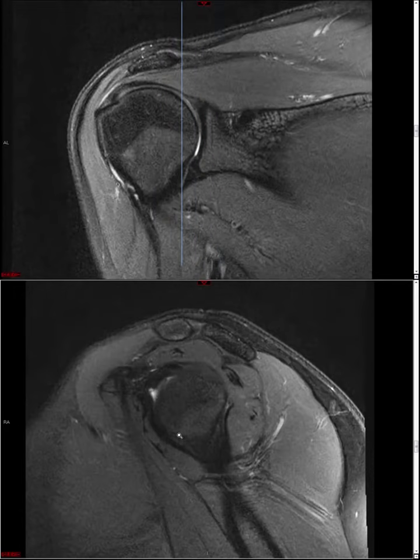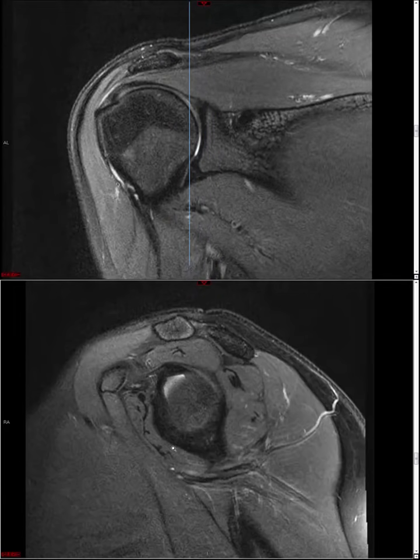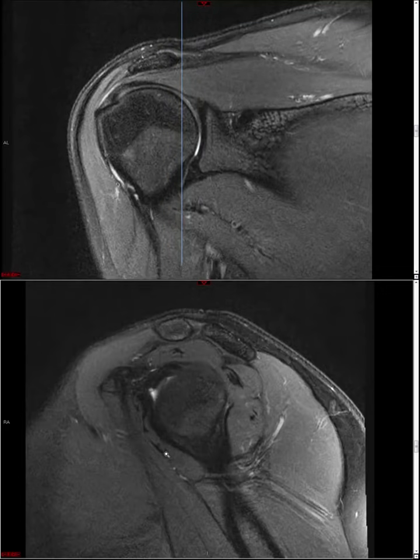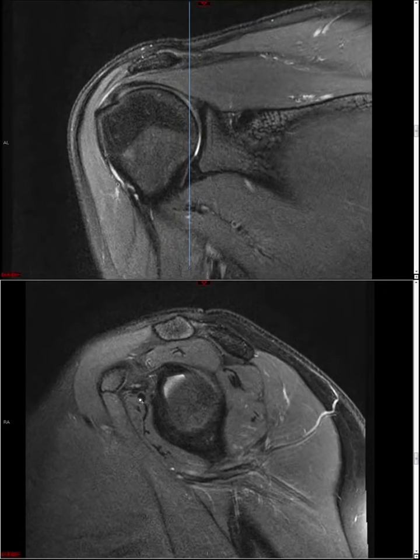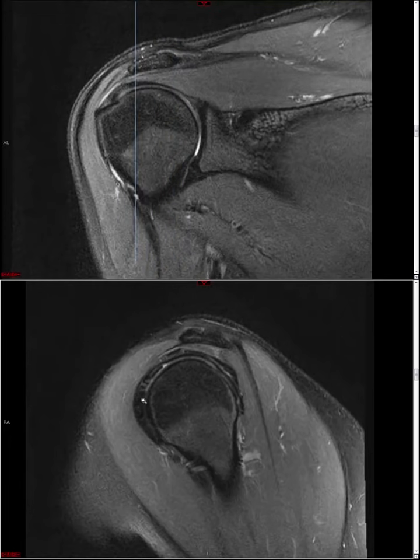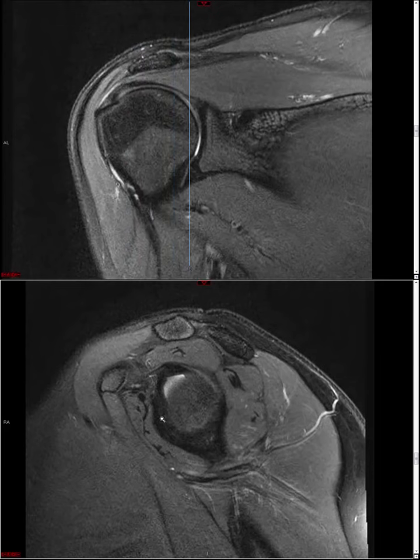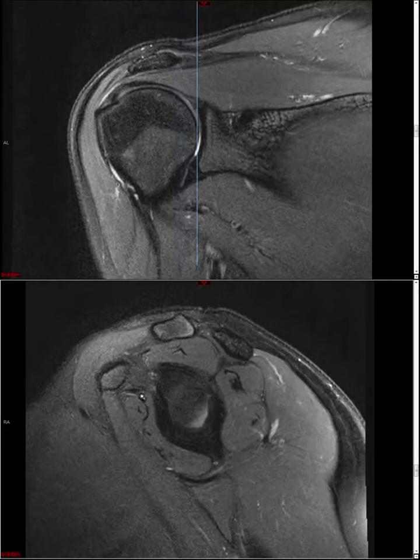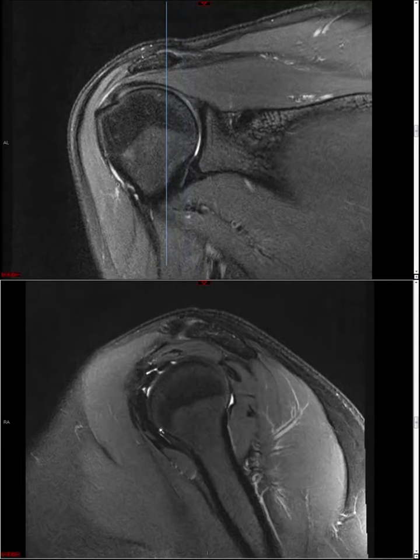Before I forget, I just want to point out that the subscapularis tendon has a multi-pennate appearance, okay? Meaning that it looks like multiple tendons joining to form one tendon at the insertion, and this can give rise to some apparent heterogeneity in the appearance, also on ultrasound. So be careful not to overcall tendinosis in the subscapularis because of this multi-pennate appearance.